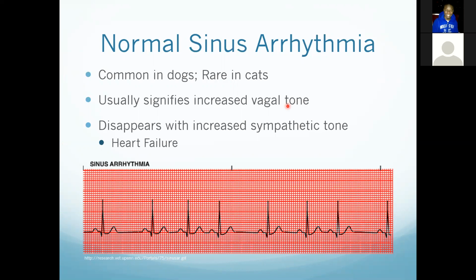Sometimes we can have a sinus arrhythmia. We see that quite frequently in dogs in particular, and that's attributable to having high vagal tone. They often have really high resting vagal tone, and that's going to change the speed at which the SA node is going to fire. So it works on those sodium and transient calcium channels that were causing a gradual upstroke in the action potential of the pacemaker cells, which have a different looking action potential that we looked at earlier. And so we'll then get a variation in the R-to-R interval as the vagal tone changes.